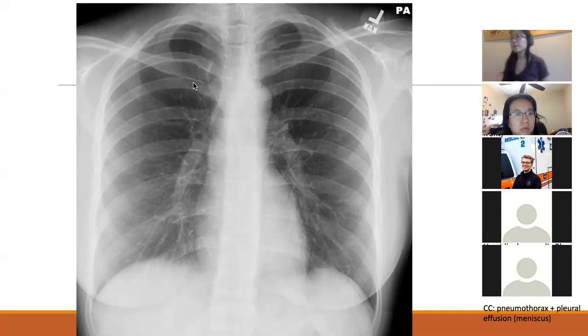Another good thing in general to keep in mind when you take these images is the positioning of the patient. So for this image, it's pretty straightforward. It's like a pretty straight chest shot, right? And you can tell that this X-ray is sort of even and balanced because these two clavicles are the same size. And the last bone that you're going to be responsible for on this exam is going to be the scapula, right? So you can see one scapula, I'm sort of outlining it here with my mouse. So that would be your right scapula, and you would have another scapula here on the other side.